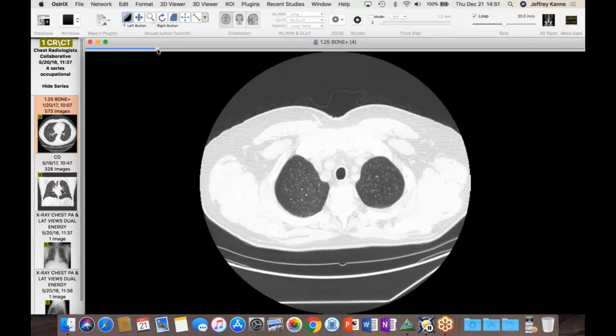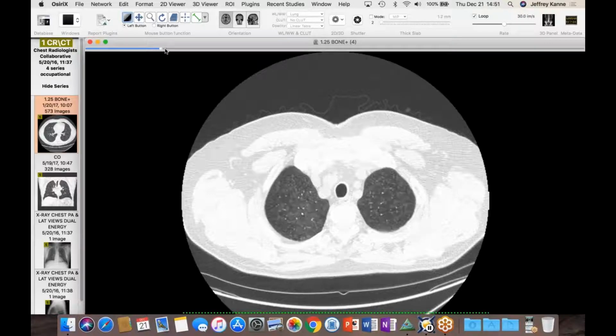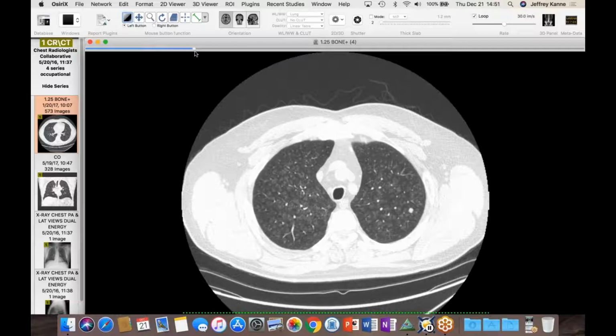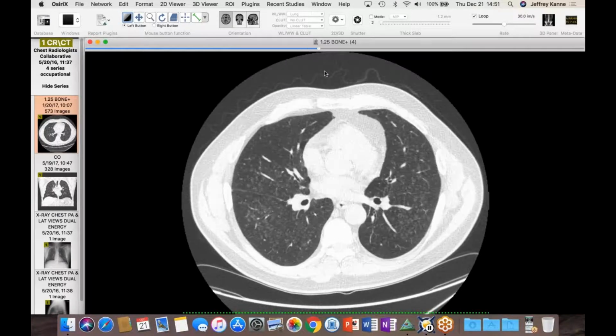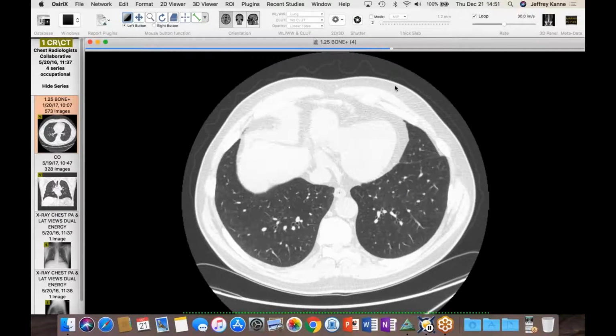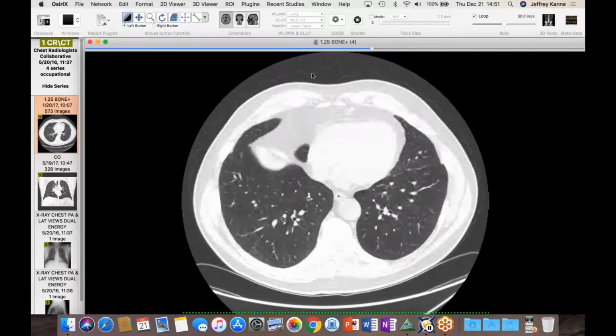This is just a quick case of a patient who was seen, and we didn't have a lot of history on him at the time. And you do see a CT, correct? Yes. Good. He had these very extensive ground glass centrilobular nodules in the upper lobes, and then he had this more solid nodule. And as I scroll through, you'll recognize that there's sort of a gradient, and as we get to the bottom, they're almost non-existent. There's a cyst here and there.